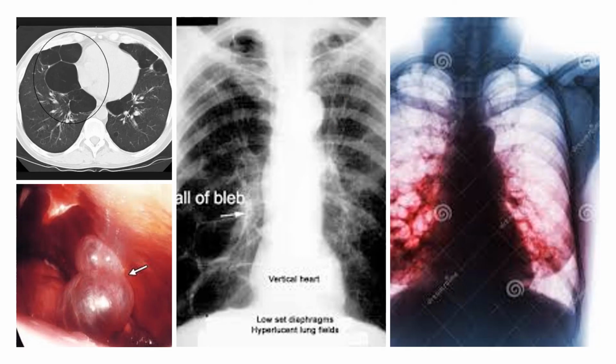All right, blebs. I want to talk about this real quick. COPD emphysema patients. This is something that you got to pay attention to, especially if you put them on a ventilator. They have these sort of weak areas down in your lower left here. I've sort of highlighted that bleb. It's sort of like an aneurysm, like where you have that weakening of an arterial space. It's very, very prone to rupture. And this is of the lung tissue because they have such advanced lung tissue.